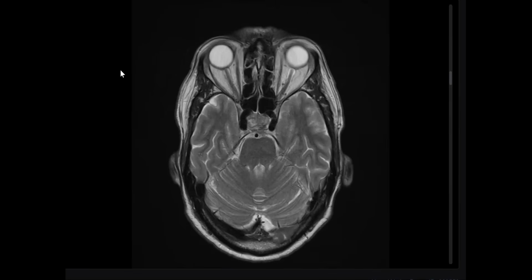In a normal appearing MRI, I think we discussed in a normal appearing CT brain, we should assess any subtle hyperdensity like subarachnoid blood, whether cortical or in the cisterns, like cortical vein thrombosis or dural sinus thrombosis, like hyperdense vessel sign, like cavernomas, any subtle hyperdensity, and also hidden areas. In MRI, I'm looking for hidden areas.